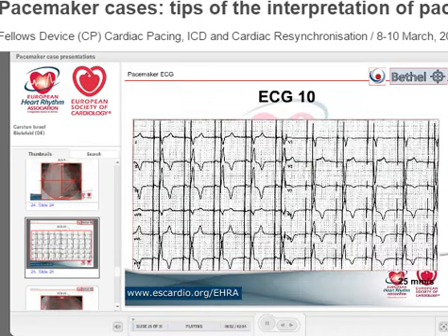Coming to the next, is this lead in the right or left ventricle? Somebody said it's in the right ventricle. How do you know? Yeah. Now this is V1, a deep S, like left bundle. Now look, this is nice. There's a transition between V3 and V4, like in a normal natural rhythm. So it's in the right ventricle, but something should be different, right?